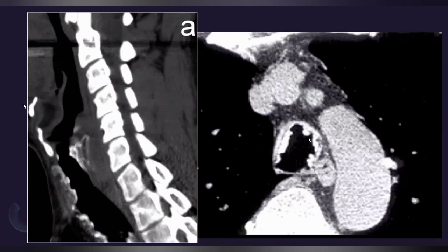There's one important point which was missed, which is relative sparing of the posterior wall, the posterior ring, because that's the muscular wall. That's a muscle there, so it's spared. The cartilage is only U-shaped, right? So it is the cartilaginous part, the medial and lateral wall, that is involved. And it's calcification, and it's involving throughout the trachea.